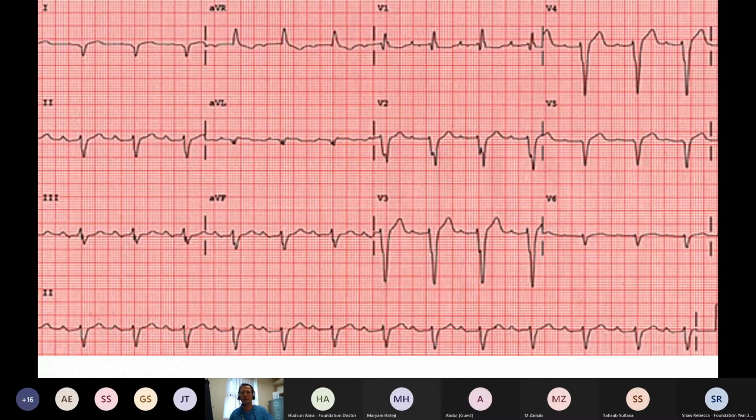Will has said right bundle branch block. So I've had a request to explain some of that again. Could I just do with a little bit more specific which bit? I'm recording this, so you'll be able to listen to that back again. And if you want to ask me questions in emails, I probably would prefer that rather than going over the whole of that again. So now, Chris has said left bundle branch block.